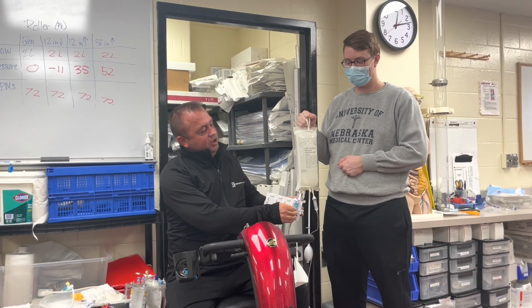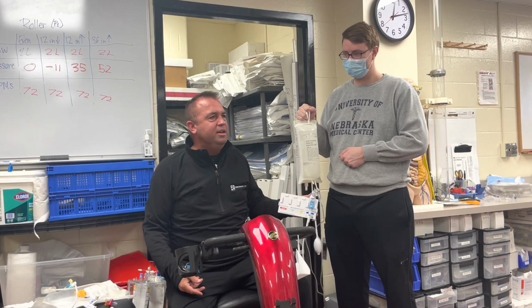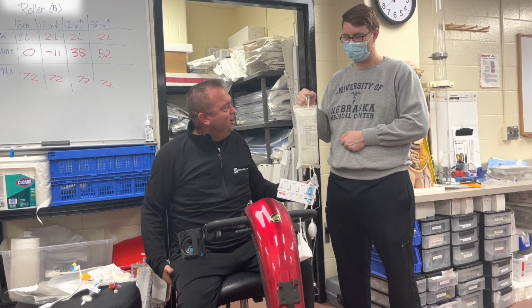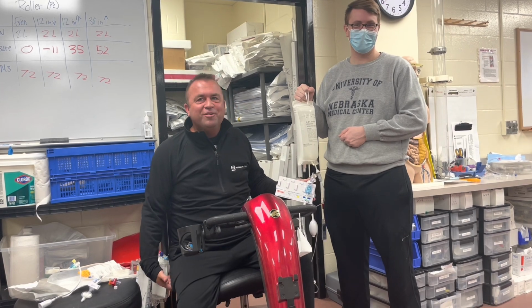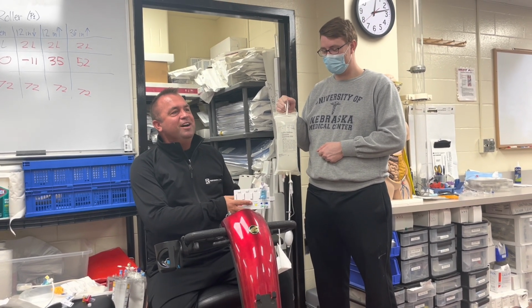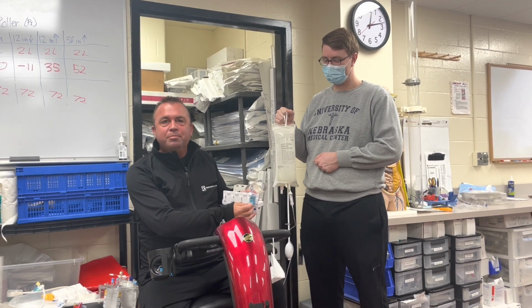I might run it a little bit extra on a fast flush, so that when Scott's up at the table, maybe he's the scrub tech or something like that, starts to feel, I don't know, that feels a little funny, right? Something's running down my back. No, I don't suggest that, obviously, I'm joking, but so that will fast flush out and through that pressure transducer.